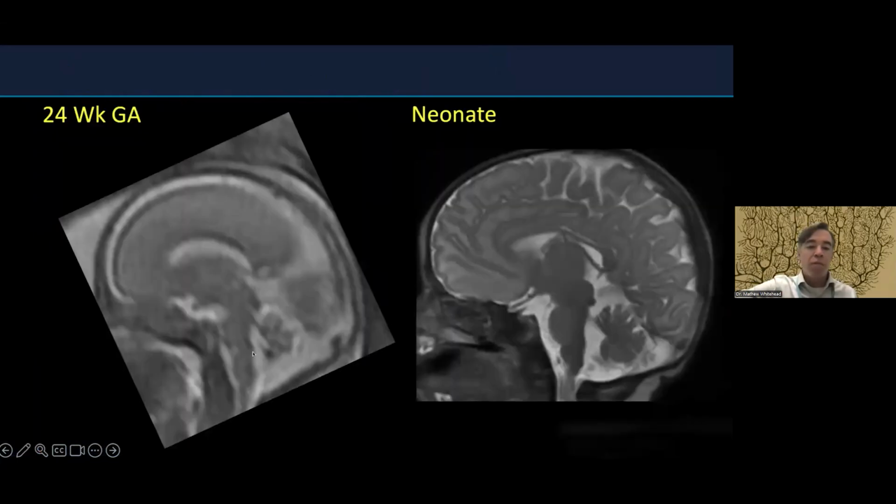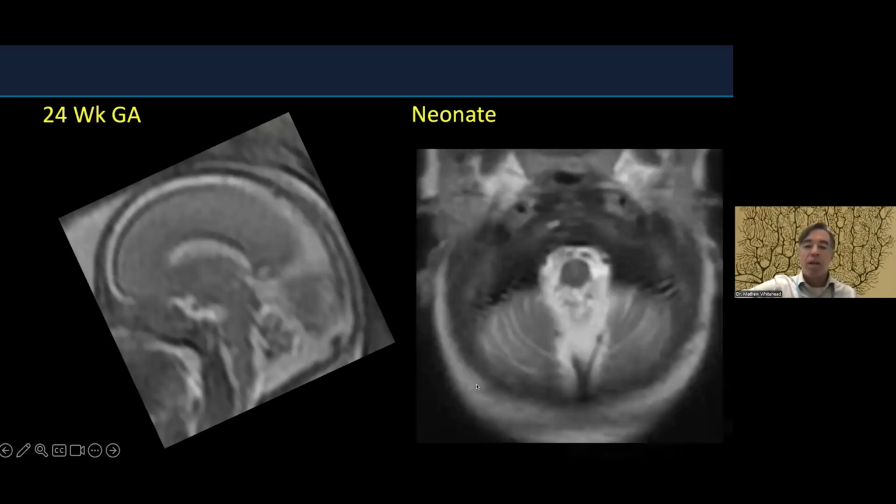But sometimes you can have a residual tilt even after birth due to a late rupture. In these cases, this can be just like a Blake's pouch diverticulum. So there's no true cyst there. Maybe there's some residual cyst wall, but there's free flow of CSF, as you can see, this low signal coming from the fourth ventricle into the cisterna magna around the lower brainstem in the sagittal and axial planes.